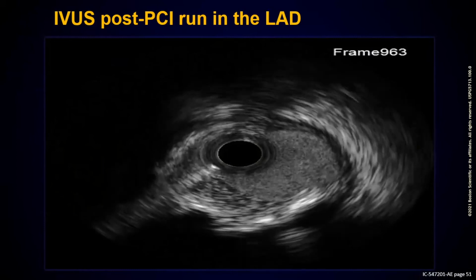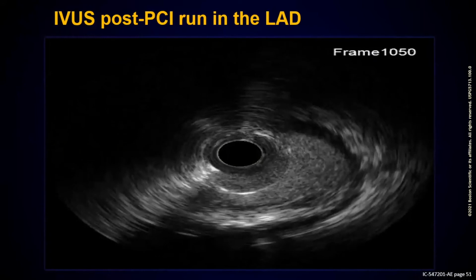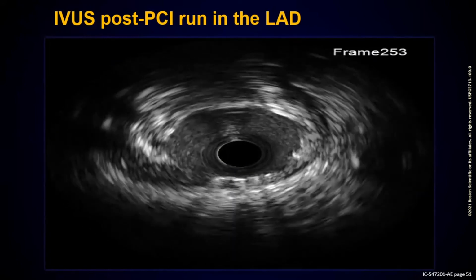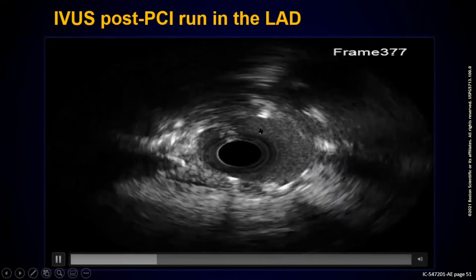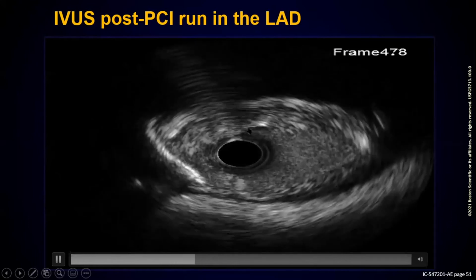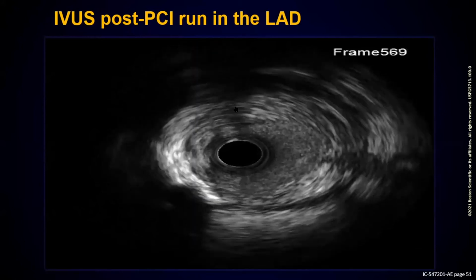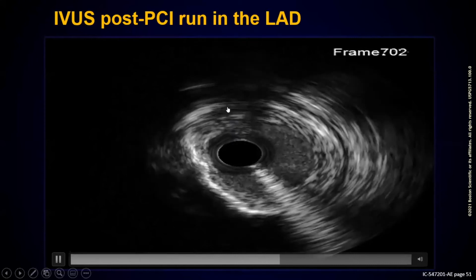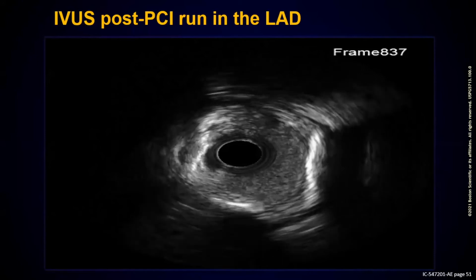Farhan and Shadia. Yeah, I think, I don't know what you think, Prof, but it looks like there's some atherosclerosis developing, but not massive, inside that stent, as you said. Obviously you can see the calcium burden, more fibrocalcific there, I think. I don't know if you agree, but as you're going through, there is a marked decrease in the luminal area, with the calcium around that area between probably 7 to 11 o'clock, really.